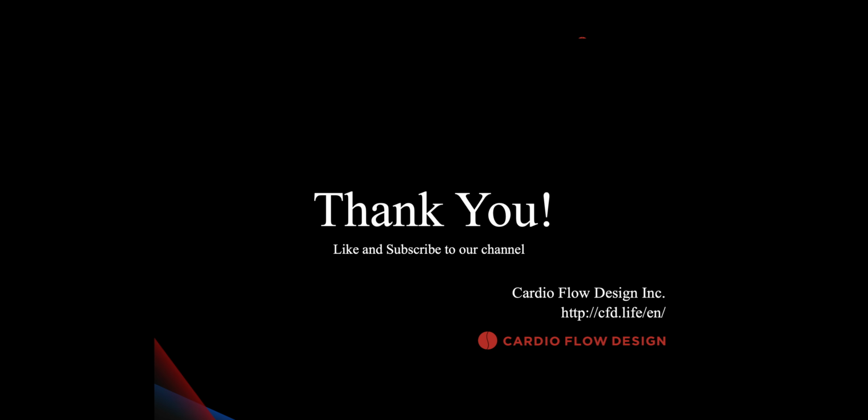In conclusion, iTFlow software provides a powerful suite of tools for detailed analysis of cardiovascular dynamics, focusing on both ventricular systems and including detailed observations. This enables us to diagnose, evaluate, and monitor patients with precision and improve clinical outcomes.